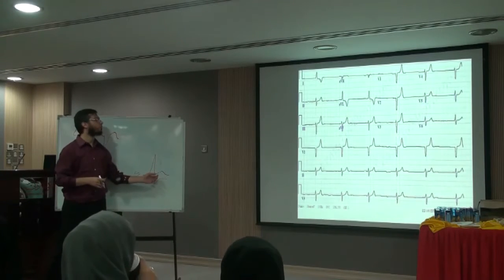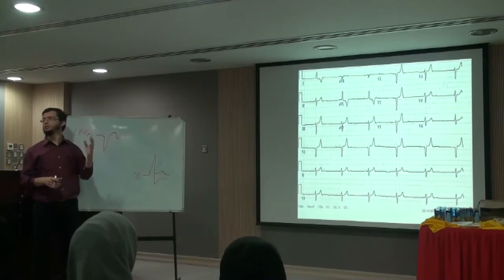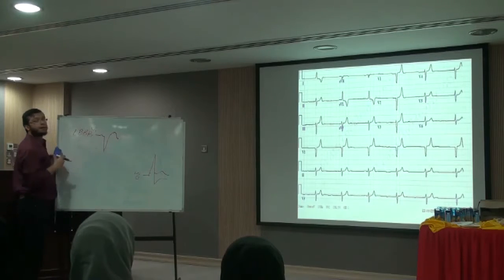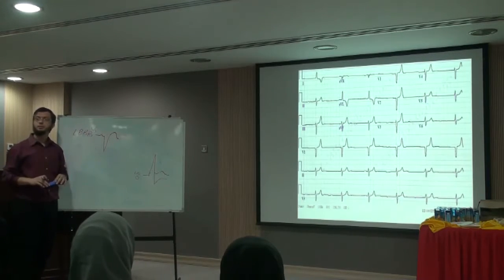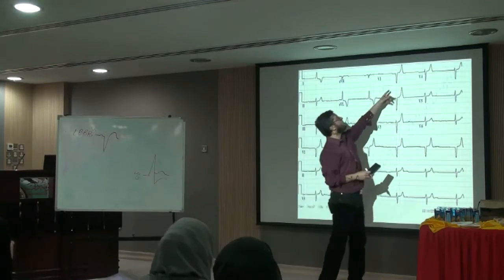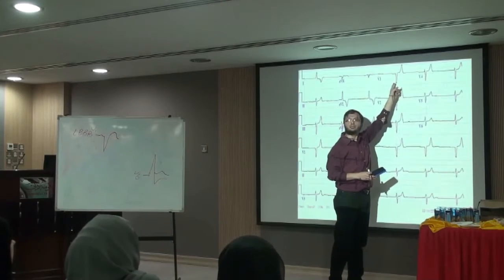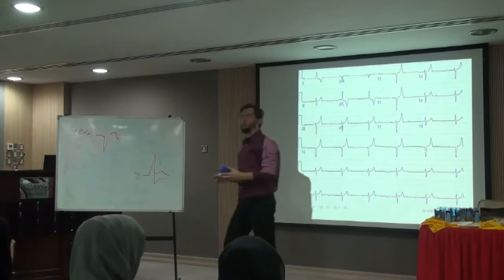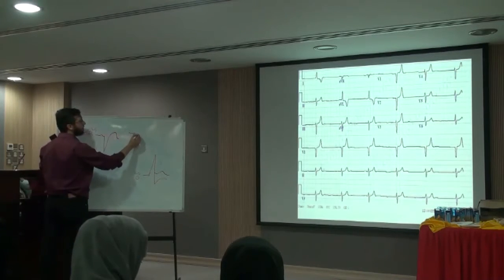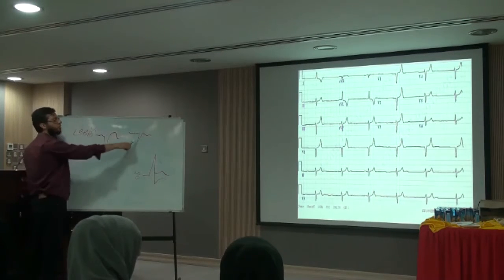So the ventricular complex usually has a discordant T wave. Except in V1, or normal? In all the leads. If the patient has a ventricular beat, this is ventricular: negative QRS, so positive T. If this one was normal, and it is in V1, V1 usually has negative P, negative QRS, negative T. So this is a normal beat.